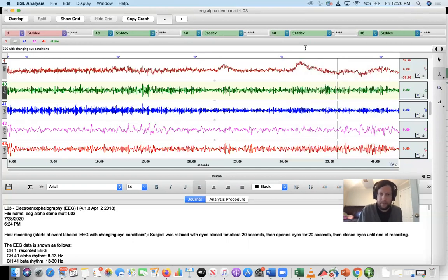So yeah, when you're writing these decimal places into Excel, go to at least the hundredths place. Thousandths place might be a little bit better, but at least the hundredths place should be fine. So I ended up showing you how to measure the amplitude for this one too. What I really wanted to show you though is make sure that you know that trial 1 here starts at around the 2 or 3 second mark right there. That's the first trial. This is trial 2, trial 3, trial 4, and then the stuff at the end, you can just ignore that. This is an eyes open trial, eyes closed trial, eyes open trial, eyes closed trial. So that's the other data file.